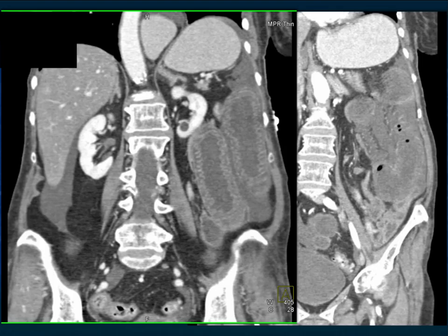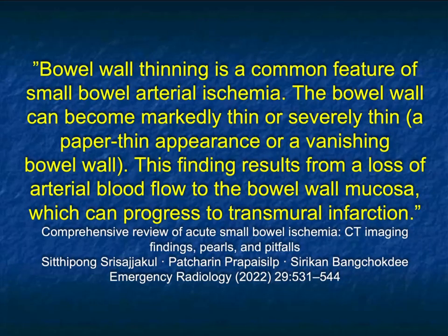Again, look at the images. Here's a few more. The fold thickening of the bowel, the dilated bowel, the thickening, and the lack of enhancement of the bowel, and the presence of ascites. To me, when you're looking at ischemic bowel and you see abnormal bowel loops, whenever I see fluid, I'm always thinking there's ischemia present. And I'll talk about that also when we see hernias like incisional hernias or inguinal hernias. It's one thing to see the bowel loop, you look for dilatation, but when I start seeing a little bit of ascites present, I'm always worried about ischemia.